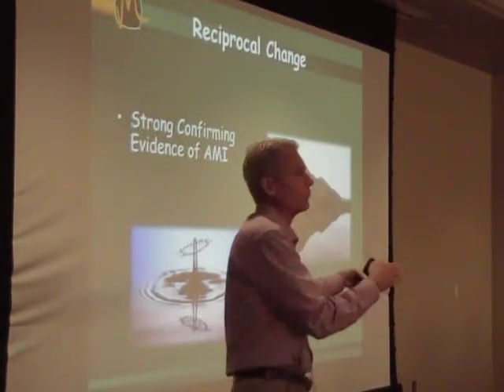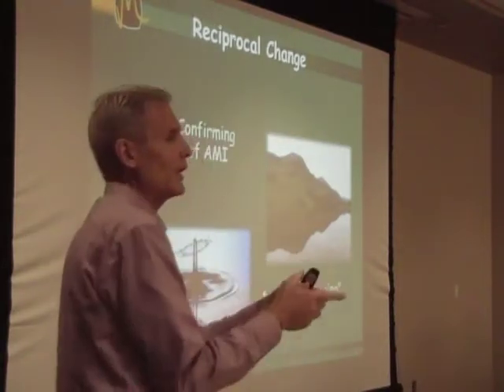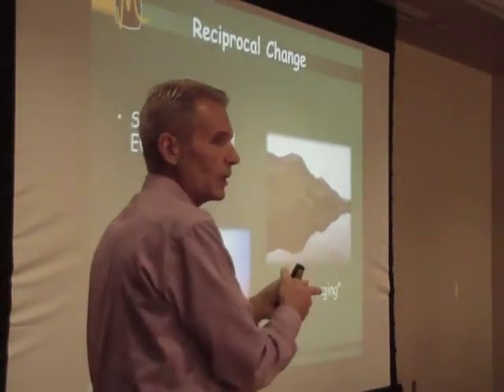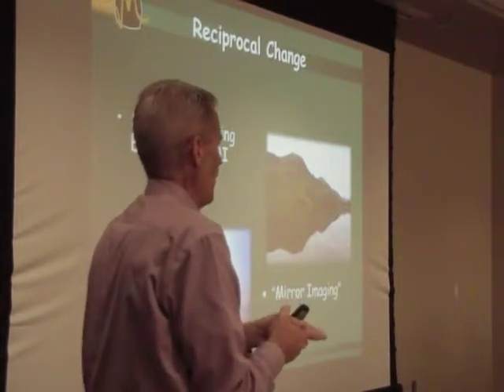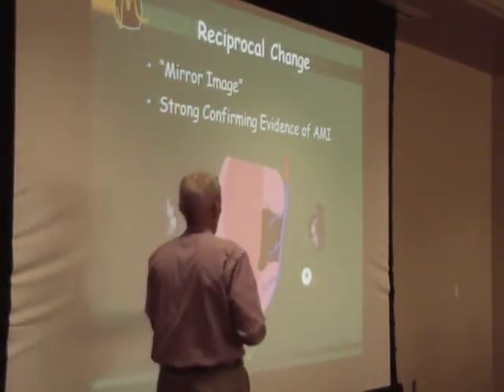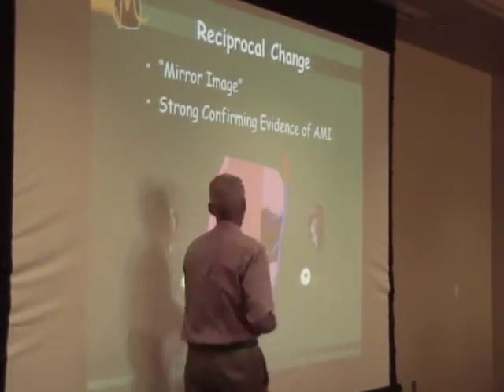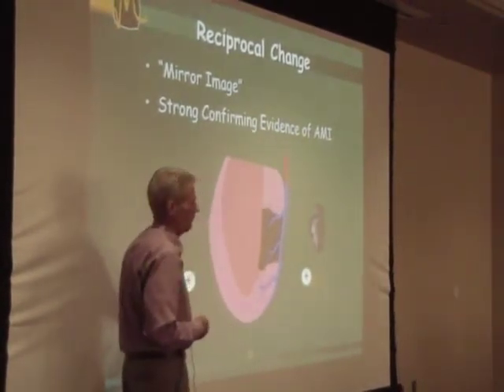And it's strong confirming evidence that we do have an infarct, because not only do we have leads looking at the injury site showing change, but we've got leads opposing the injury site showing the same change in an upside down fashion. So that's what we've been seeing on those EKGs. So again, camera looking directly in, we see J-point ST segment elevation. I take a camera from another plane looking directly in, it's going to be upside down.